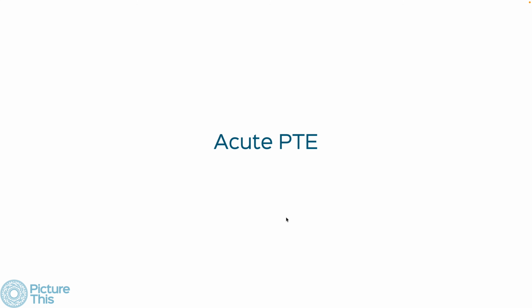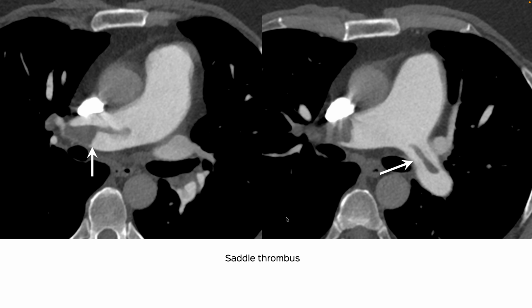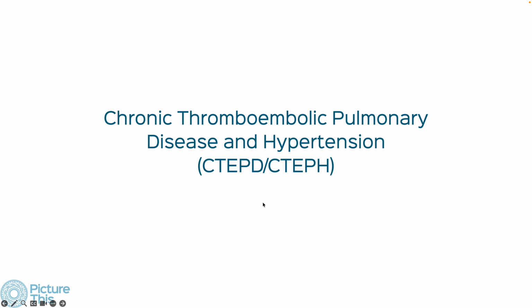The third category are the vascular pathologies. All of us are now aware of acute pulmonary embolism being diagnosed by CT pulmonary angiography, where we inject contrast to make sure that the pulmonary arteries are opacified, and then all these filling defects that we see represent thromboembolism, and sometimes we may also see infarcts and other complications. Here is the filling defect in the lower lobe artery.